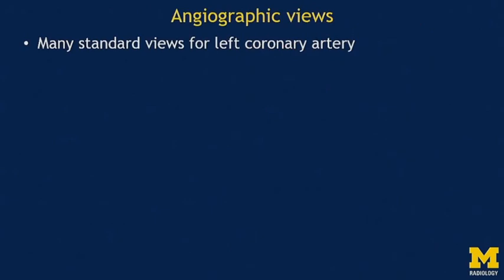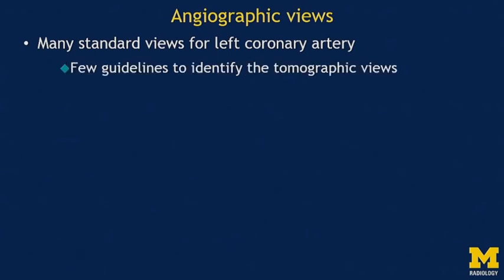Now let's touch upon the angiographic views, and my idea is not to do a comprehensive review of these projections, but only so much that you get comfortable looking at these angiographic views, particularly when you're reading a coronary CT angiogram. So there are various views, and I'm not going to talk about all of those, but there are a few guidelines how you can identify these tomographic views.